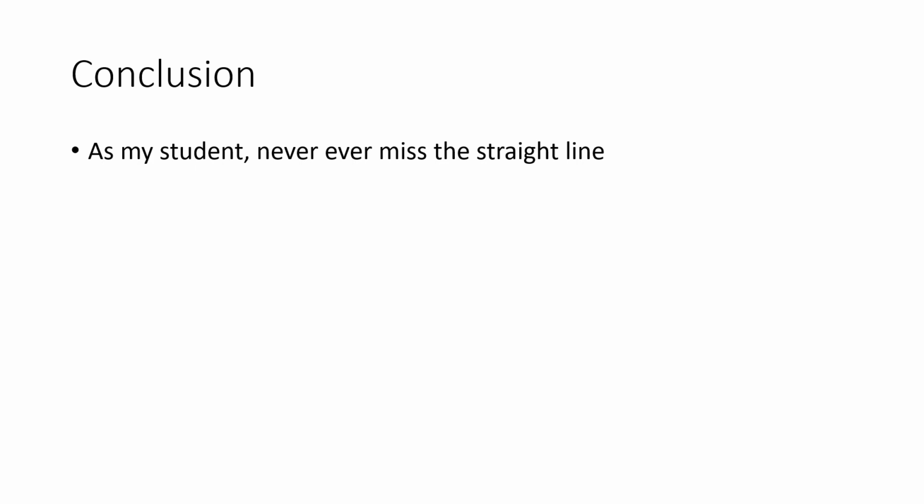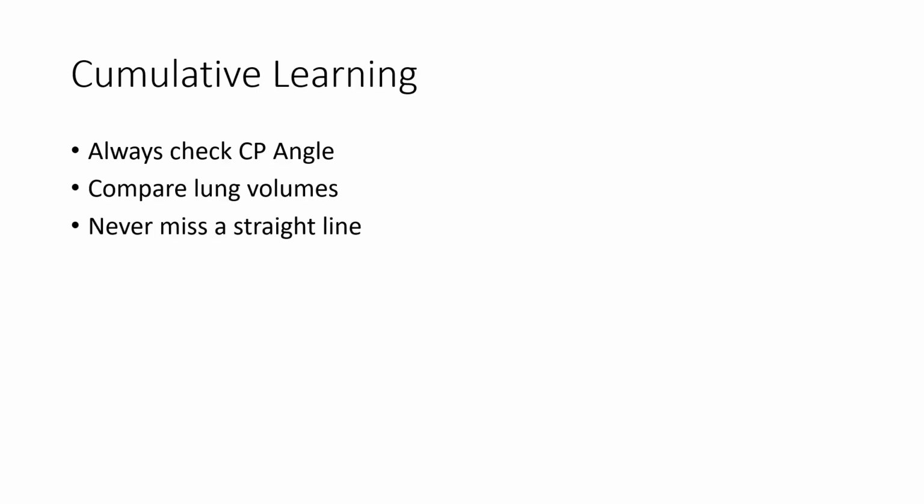So whenever you see an X-ray with a straight line, the first differential diagnosis that you have to think about is hydropneumothorax. The straight line should be through and through from the lateral to medial aspect, and above should be air, and below it should be fluid filling. And if that is there, then it is a hydropneumothorax.